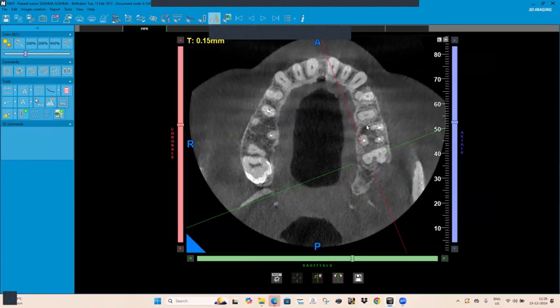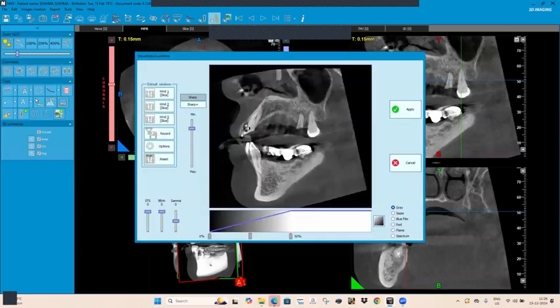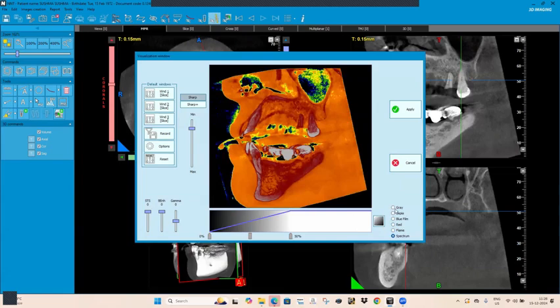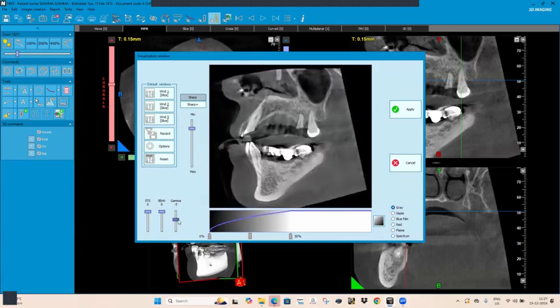Is the screen visible now? Yes, ma'am. So now the images are better than before, I think. We can locate the canals better than before. Can you double click again, ma'am? Just try the right side filters below the cancel point. Sepia, blue film, red. So this also we can use. But there are different filters. We have to use them according to what is the best for us.